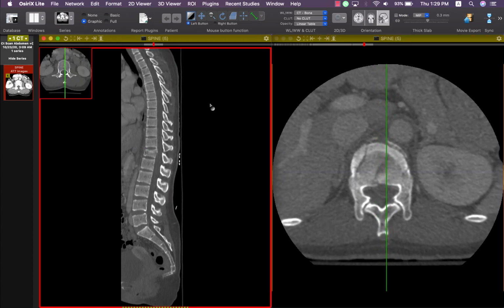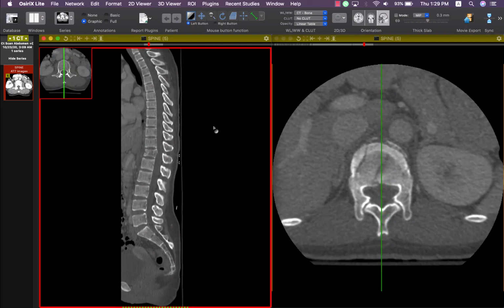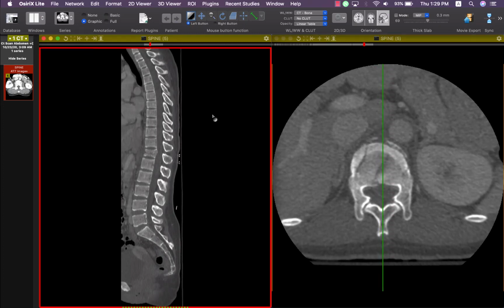And it is important, as I said before, to determine the type of the fracture. It is very important actually. And we have a scheme to reach the proper and correct diagnosis for the type of spinal fracture. The first step in the scheme is to look for the alignment.